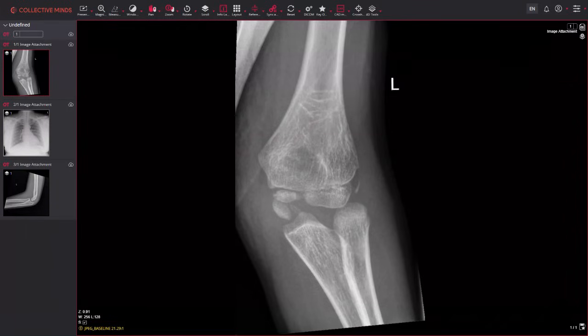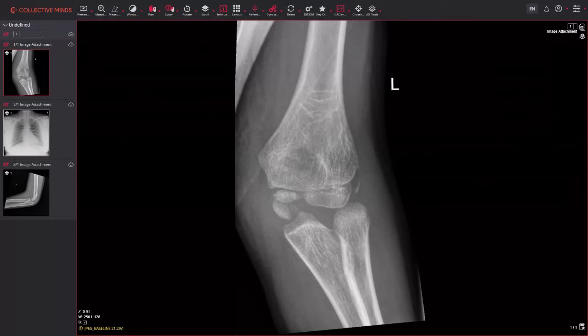Really, technically, there's no such thing as non-displaced. Sometimes you'll see non-displaced fracture, but if it was non-displaced, we wouldn't see it. The only reason we're seeing it technically is because there's a gap, and that's what causes the lucency, the gap between the bone. So there has to be a degree of displacement in order to see the fracture on the X-ray. So if there's hardly any displacement at all, you can use the term minimal. If there's a little bit, mild. If there's a lot, significant.